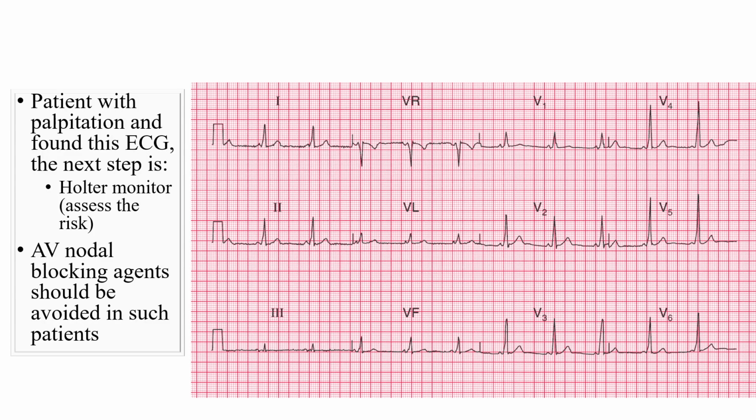Here is a real ECG. This is a patient who has a short PR interval, as you can see here, and there is a delta wave here. This is a short PR and this is a delta wave, apparent here with a short PR interval, delta waves, and a somewhat wide QRS complex.